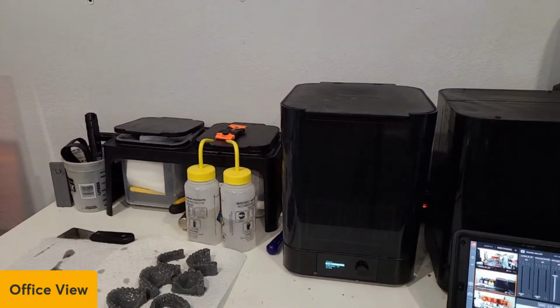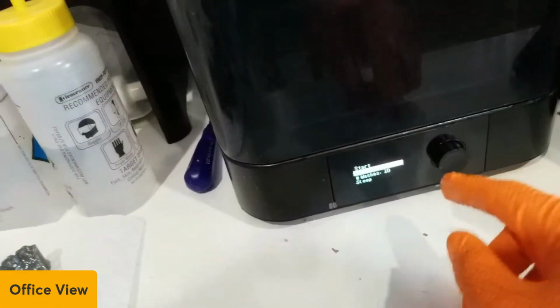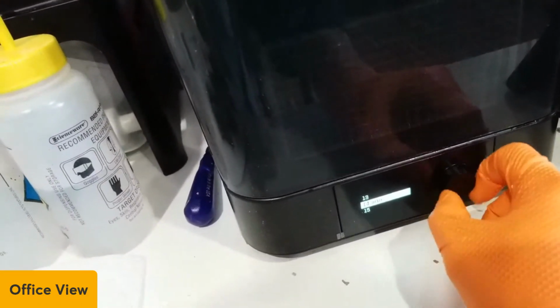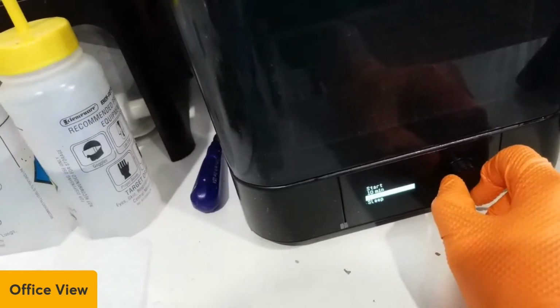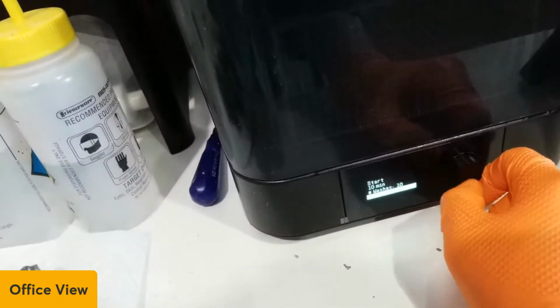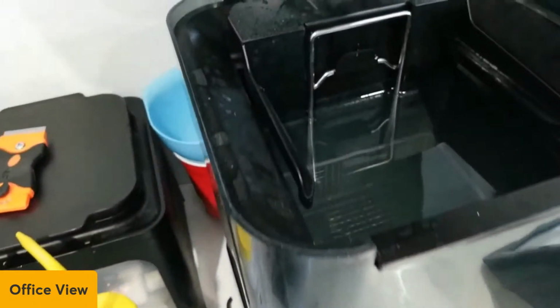Maybe I'll grab this camera. Okay, so we have start. We only need a 10-minute wash for draft. Every resin is different. So I've done 10 washes in this using this isopropyl alcohol, and then of course that's sleep, which is weird. I don't know why it's doing that. So it changed to open. But if we open this first, you can see inside of there, it is pretty clear. There's a little swirly thing, and it's a magnetic swirler. So if you've ever done chemistry class, you know what that is. But if I click this, it opens.